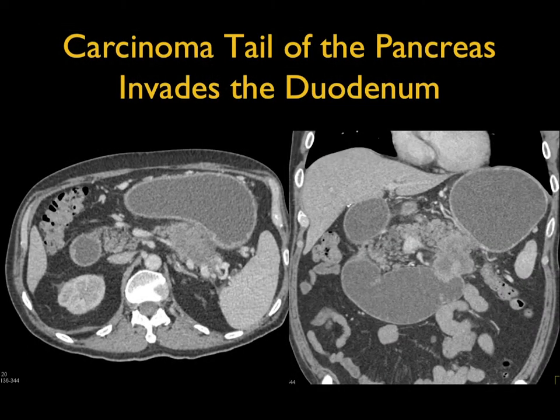You can use positive contrast. That may prove helpful. Most people use water in this scenario, but you can see some of the challenges because it's very easy to walk by tumors, because often the tumors are very large and very extensive. And here's just one more invasion.